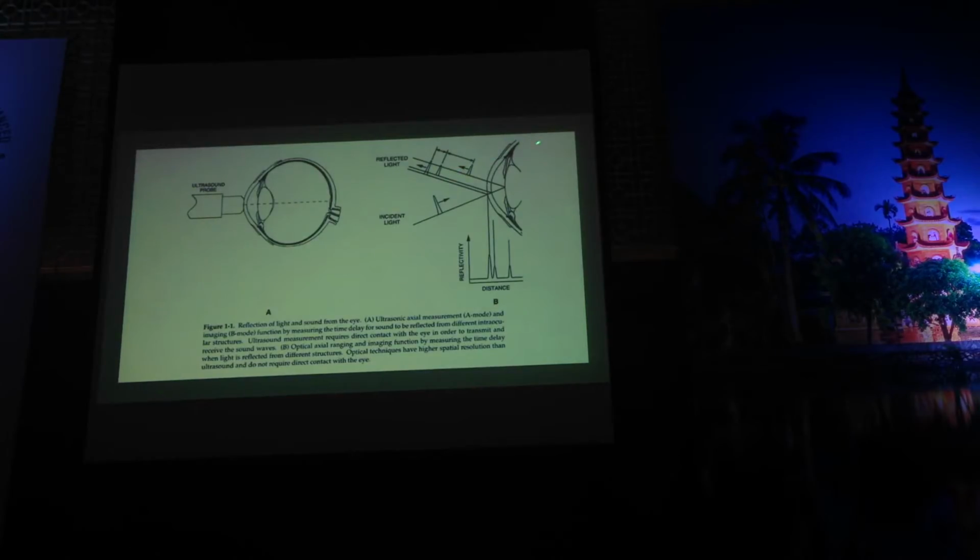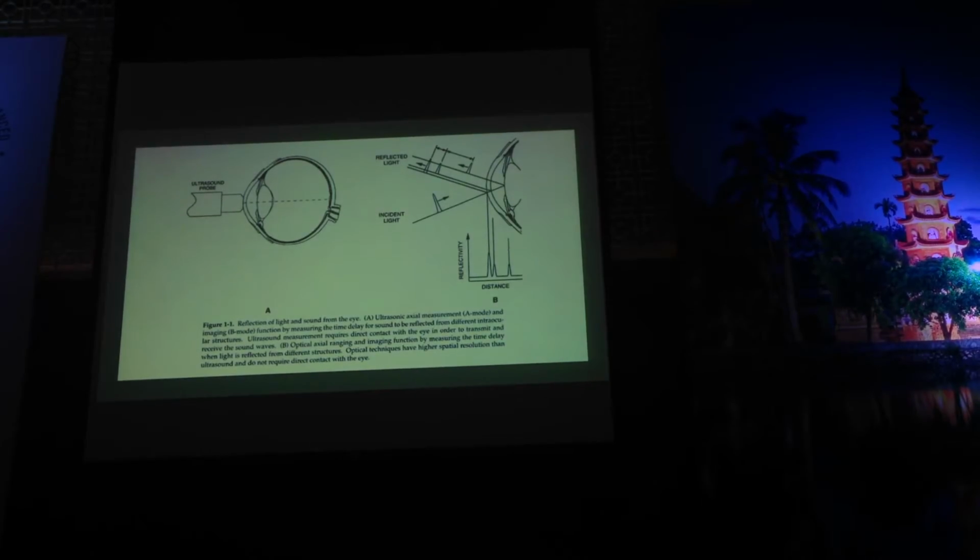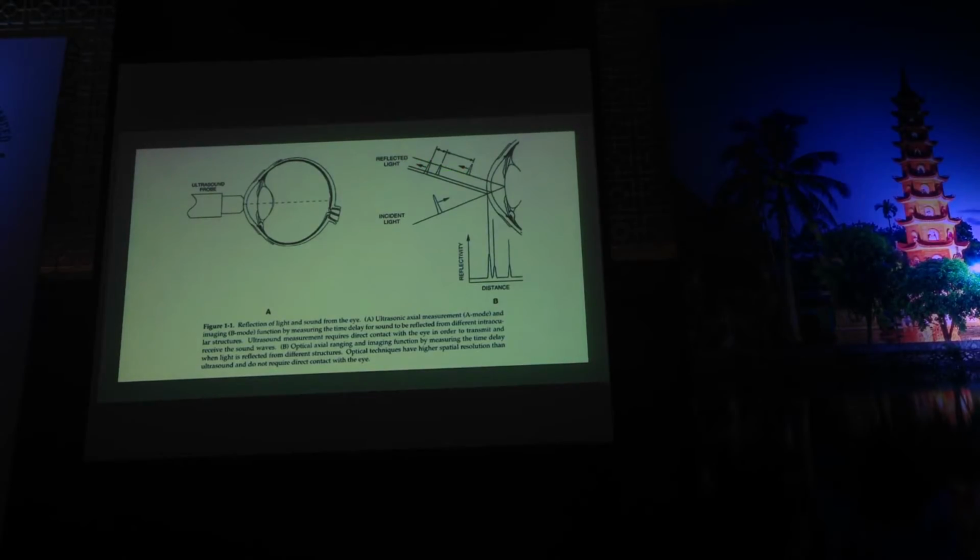So this is a kind of A scan, right? It's like the A scan that you get from ultrasound, but this is an A scan that you get from light, from the OCT, and you use all these A scans to sum up to be the two-dimension B scan. It's like the B scan OCT that I'm going to talk about later on. And we're going to have a kind of detector to detect all this reflected light.